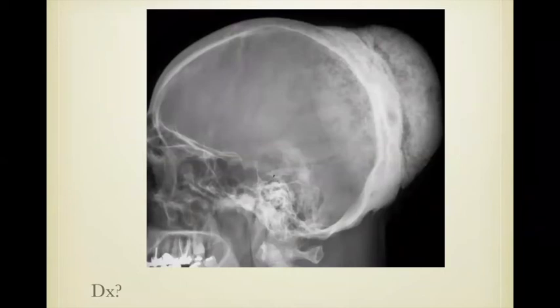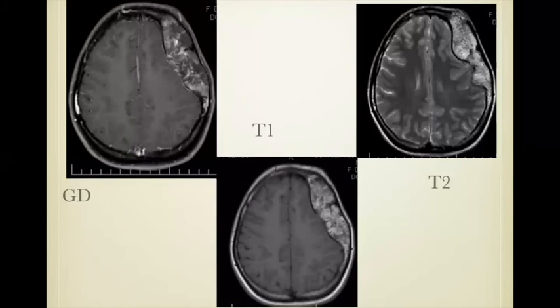I've shown you some primary bone lesions like osteomas, osteochondroma, and so on. But actual malignant bone tumors, even though they can occur in the skull, like osteosarcoma or giant cell tumors, are distinctly unusual. There are times that you should be considering them, but I generally wouldn't start with that diagnosis because of their low prior probability. But this is an osteosarcoma.